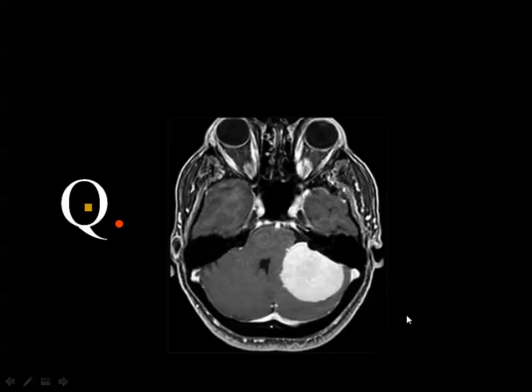The lesion is extraaxial, as diagnosed by widening of the ipsilateral cerebellopontine angle cistern. If this lesion is centered on the orifice of the internal auditory canal and extends inside the canal, you may think of acoustic neuroma, which is the most common enhancing cerebellopontine angle lesion. But if most of the lesion bulk is away from the internal auditory canal and is based on the dura, that is typical of meningioma.